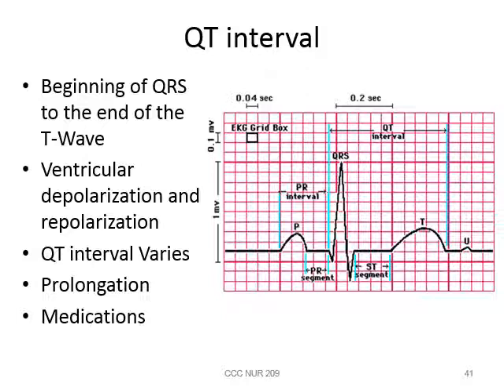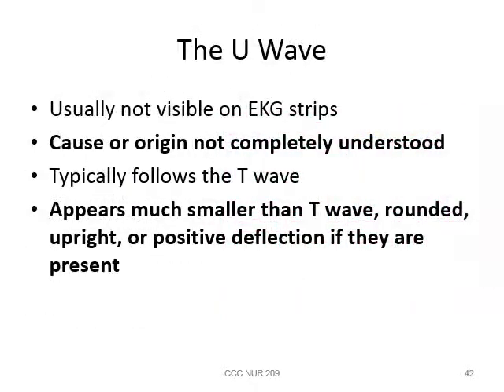There are certain medications that we must look at that are going to increase this QT interval. So if we bring these patients in and start them on this medication, part of the measurements that the nurse will take is to actually measure this QT interval. The longer this QT interval, the greater the risk that a patient can have a firing of an electrical stimulus on the downward slope of the T wave and cause this patient to go into either ventricular tachycardia or ventricular fibrillation. So a longer QT interval is something that we'll look at with particular methods.